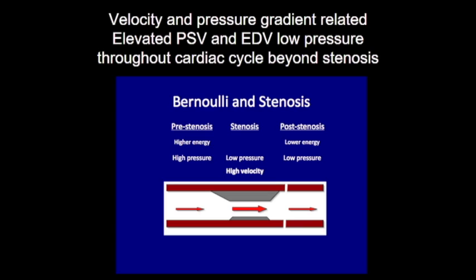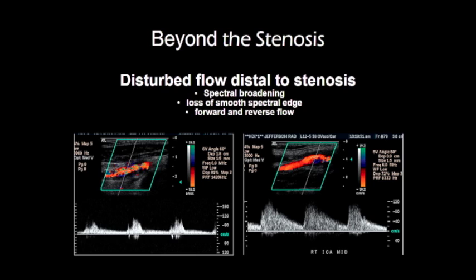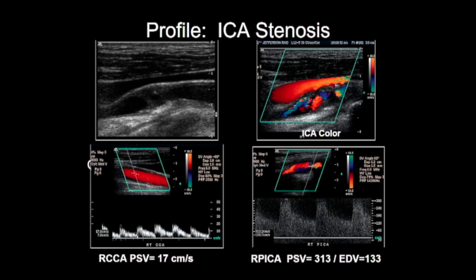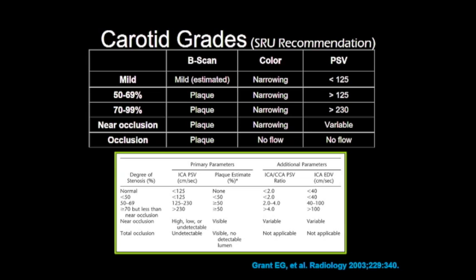Okay, now, I usually try to talk to you and give you one thing to think about for next year, and the thing I want you to think about has to do with these high-velocity waveforms. And here we see lots of systole and lots of diastole. Is this related to resistance? So we've always seen lots of diastolic flow. Well, the diastolic flow here is 130 centimeters per second, very high diastolic flow. Does it make sense to call this a low resistance waveform? And I'm not going to answer it. I know Leslie's going to ask me later, but I'm not answering it.